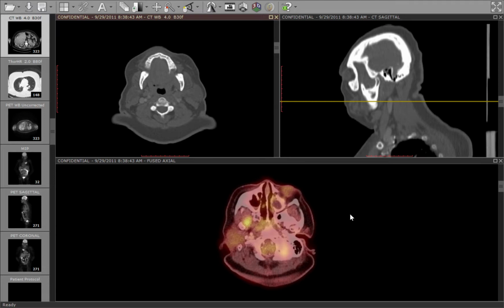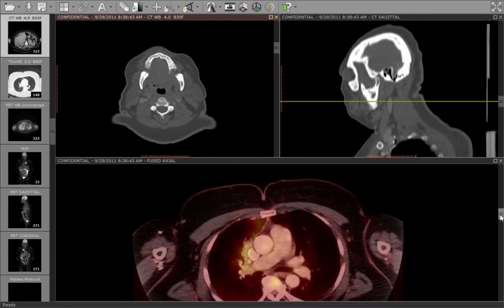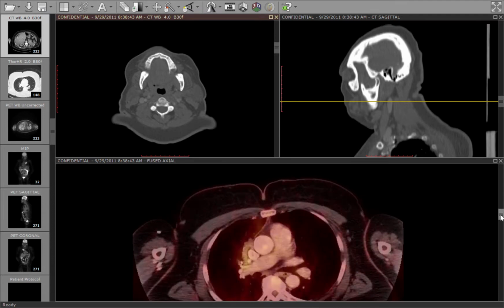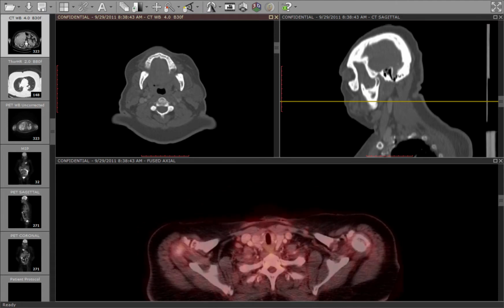on these images. And they actually fuse the image with a CT as well, so you can see anatomically where the signal or the activity is coming from. And glucose will go to sites of metabolism. So let me just show you quickly. There's the lung cancer. But that's not why I'm showing this case.